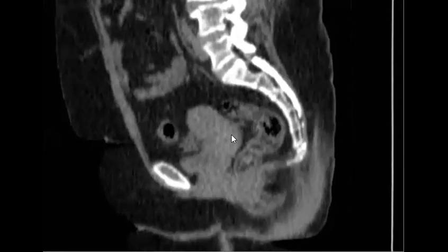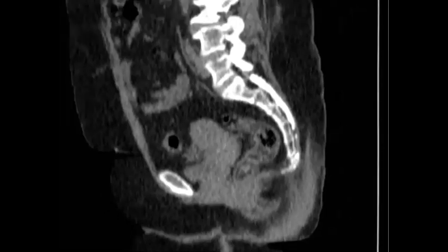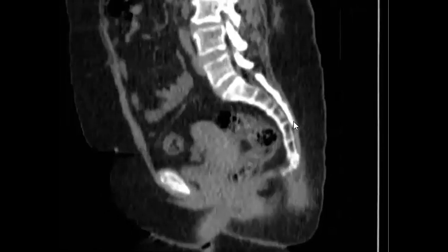Do you see the uterus? So some questions will not be asked. So take care, because if you ask this of the examiner, for example, in the FRCR, that means that you lose marks, especially when you see the image. Okay. So Rihan, perfect. Where do you see this? Where do you see this?